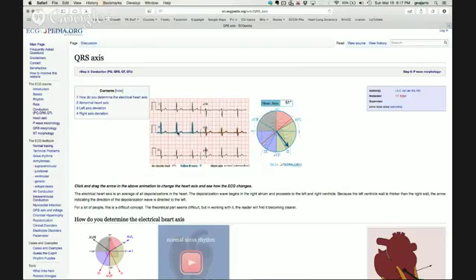So if you compare the magnitude of this QRS wave to the magnitude of this AVR, and you're trying to determine where it's closer to, either AVR, which the reciprocal of AVR is here at 30, versus this positive portion of lead 2, you could say pretty easily that this amplitude is larger than this amplitude.